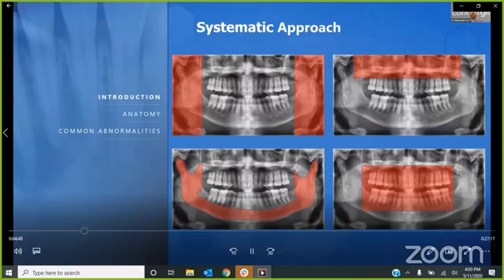And as you can see here, if you become more efficient at the way that you look at the cone beam CT, then you can complete them a lot quicker. And you gotta imagine, there's some people out there, some of you dentists, you can make $2,000 an hour with a patient in your chair. You can't make much money looking at a cone beam CT. So again, there's an example of what your comfort zone is really.